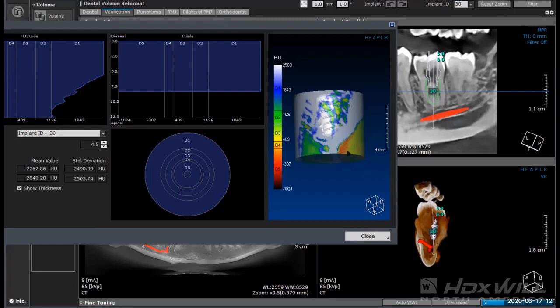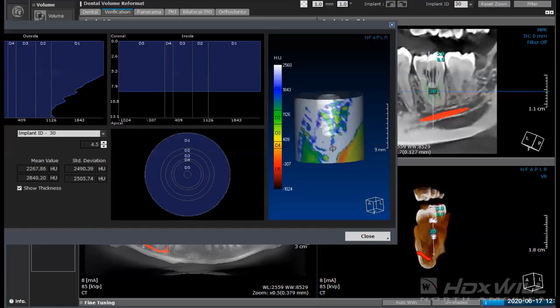So that also gives me some assurance that I'm getting numbers and images that are readable and that I understand the parts to them. So in this case, we can see the undercut. We can see that we're far enough away, but we can see it exists not only on the 3D model and our pictures, but also on this density model as well.